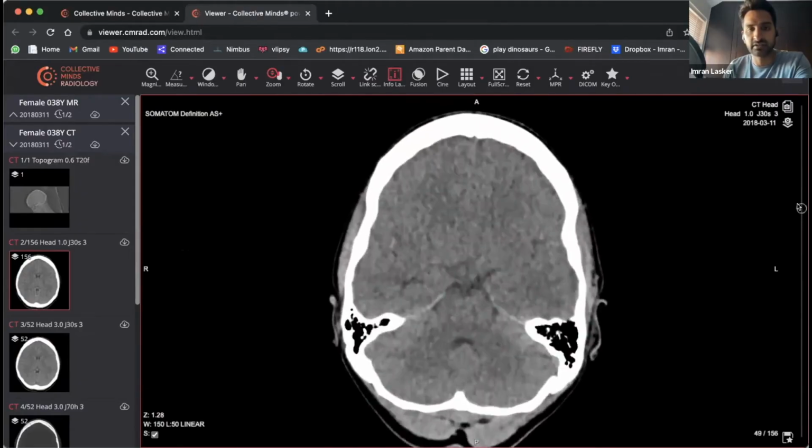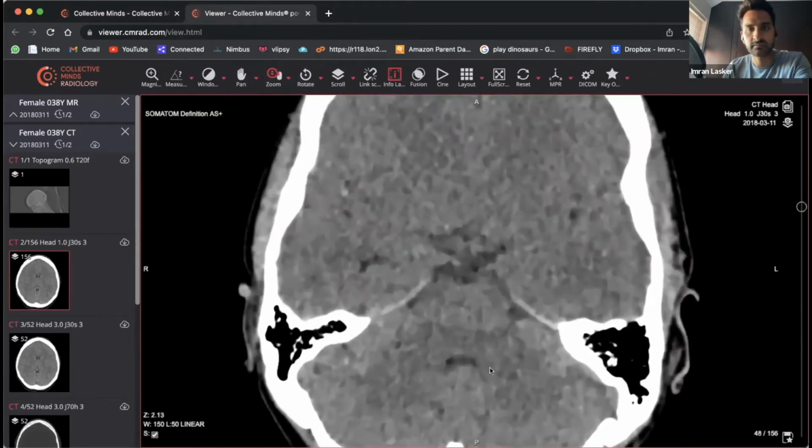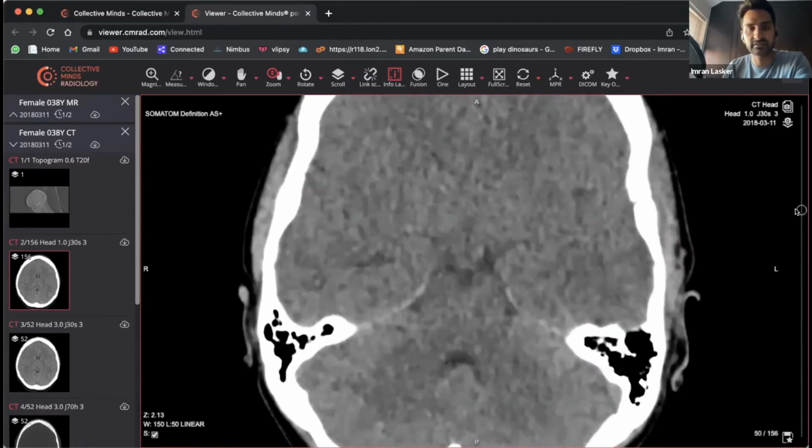you're going to end up having a little dot that appears. So look, there you go. See that? That little dot there compared to there? Looks very, very different, doesn't it? Let's zoom in a bit. And just to convince anyone, over there, compared to that, that looks slightly brighter. That's how subtle these things can be.